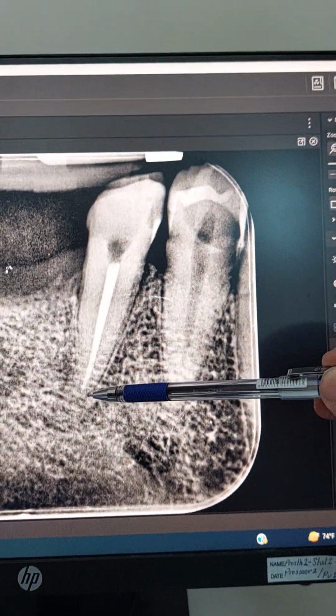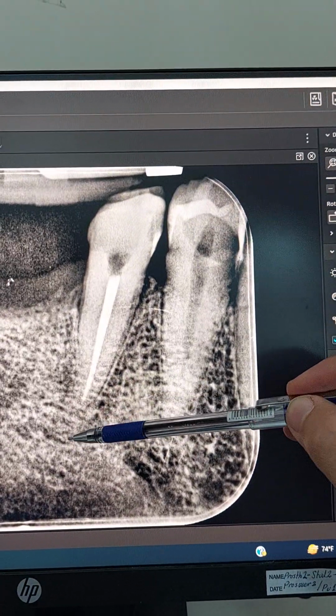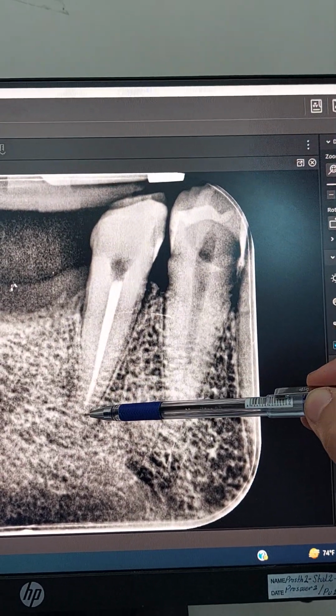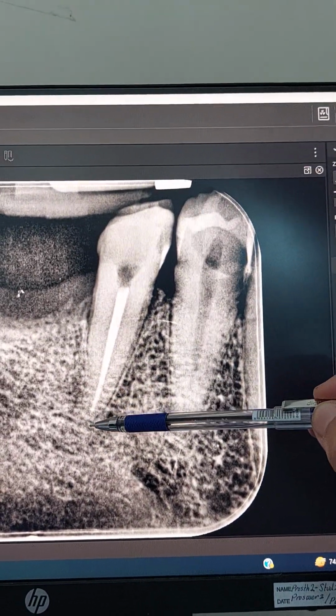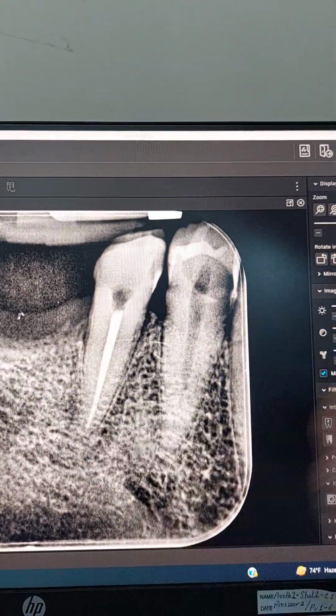What is the root end? Is it resorbed with time? I think it's here. Is it here? Now you see something here, right? Yes, you see something here. It looks like there was resorption and then healing, or you see a tracing of the periodontal ligament. I lost it here. But if I trace this and trace this, I think this is the apex, not this one. I expect it's here. It is, yeah.